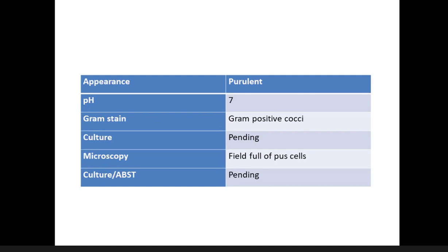In the left lung, if the left heart border is obliterated, it is the lingular lobe, and if the left diaphragm margins are obliterated, then it is the left lower lobe.